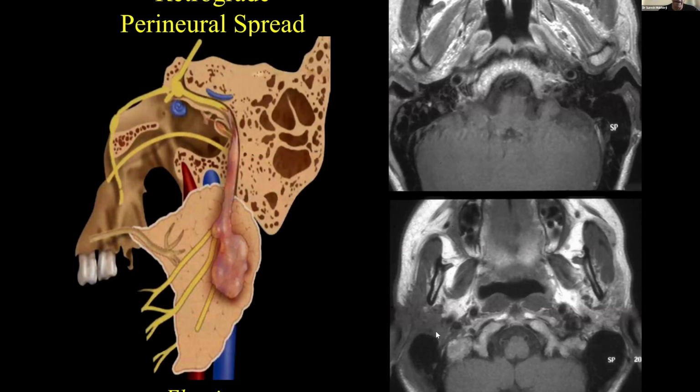So this is an example of adenoid cystic carcinoma. In general, the surgeons already know that the patients have a malignancy. Why? Because the facial nerve is not working. So if the facial nerve is not working, then the next decisions that the surgeons have to make is, can I do a parotidectomy by itself? Or on the other hand, if the tumor is actually involved in the descending portion of the facial nerve, do I need to go in and actually drill out the facial nerve? And if it's actually too extensive, they may end up treating the patients with chemotherapy and radiation therapy.